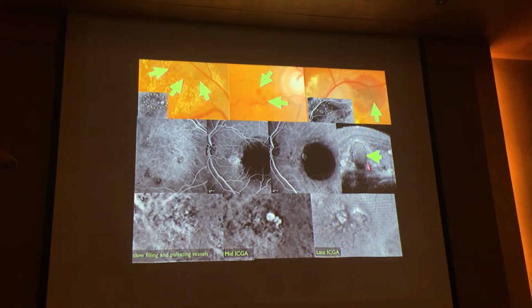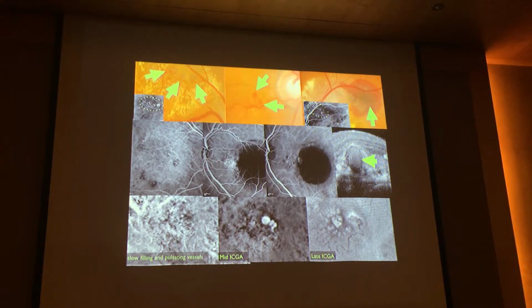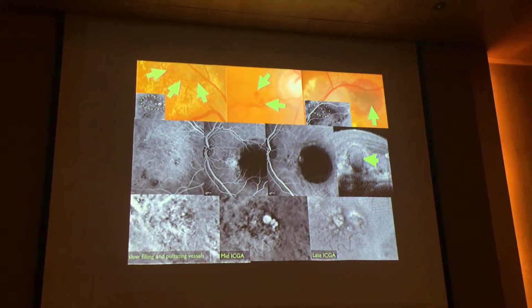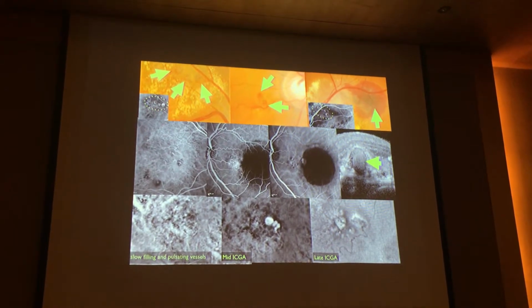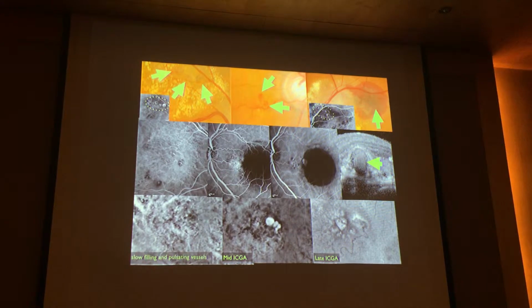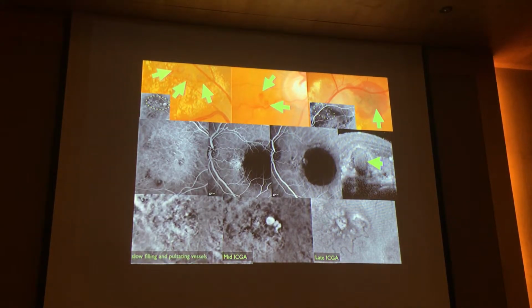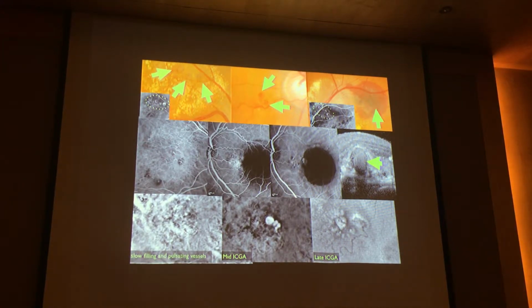Because the retinal thickness is not at the right ratio. It's increased in height to show the layers better. In fact, there are some instruments with which you can actually get the real proportions, and it's very thin and you are not able to differentiate the layers. So if it's round and it's stretched, it's oval.